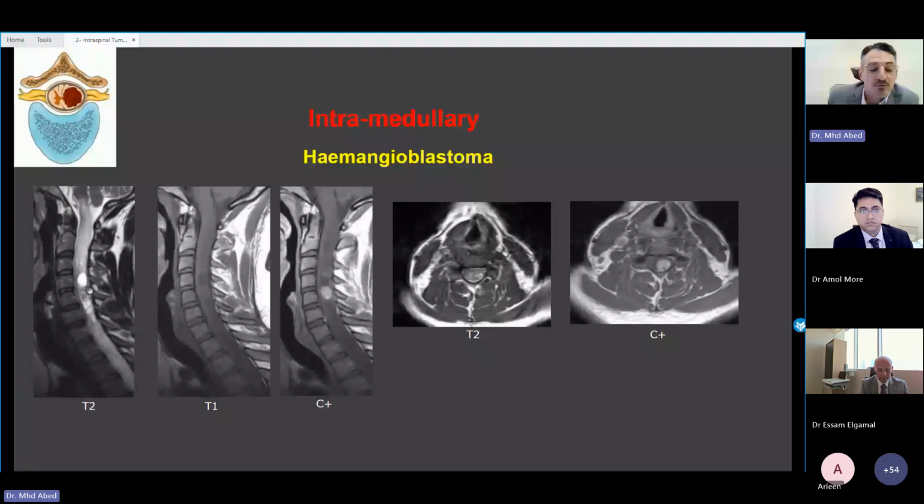And the hemangioblastoma is highly associated with flow voids because of the hypervascularization. And if you look here, it's not clearly within the spinal cord. It's eccentric compared to the ependymoma. It has more of a pial-based location.